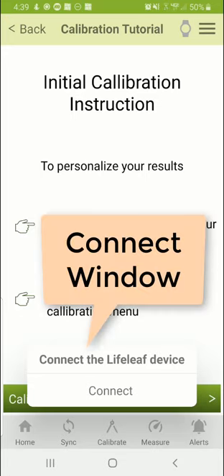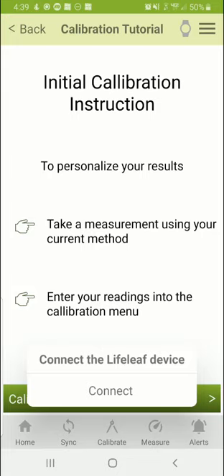window, so that when you click on the connect, it will connect to the watch, because after the login you have to always connect and go through the pairing with the watch using the QR code. But I'll not show that in this particular demo, because I've already shown it in a different demo.